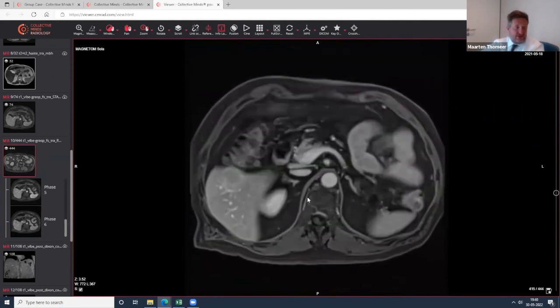Okay, those were the cases. To resume, what I would like to help you understand about the evaluation of liver lesions is to always look at the lesions in the liver the same way. Look at the T1, is it iso or not? Look always at the in phase. Look at the T2 and washout. It's always the same, and so in most of the cases you can make a reliable diagnosis. So a biopsy is not needed anymore.